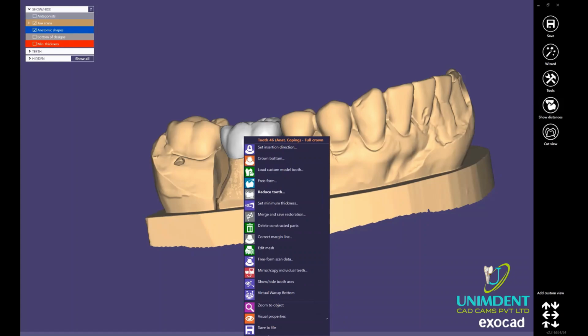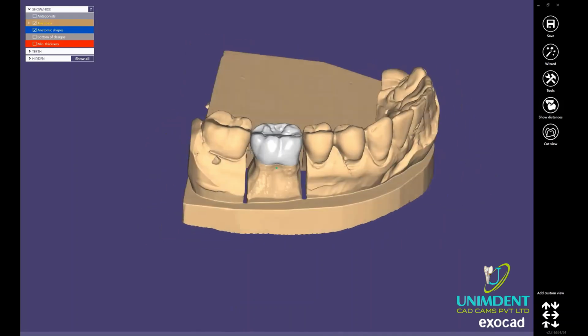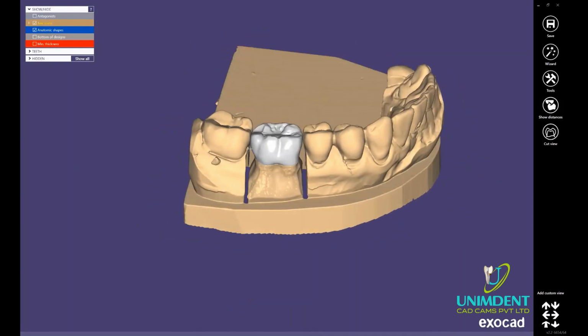So our options here, don't worry about them, are pretty easy, and we will talk about them later in different types of projects, because it depends on the project you are making, and here you will have more or fewer options. Okay, so for this video it's pretty much everything. It's just a fast review.